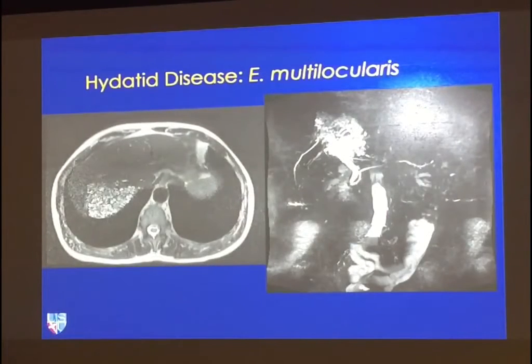Right. So I mentioned that there's a less common subtype of hydatid disease, multilocularis. This is something that we only very rarely see in imaging, but this is kind of a bad, virulent form that occasionally pops up, in less than 5% of the cases we encounter.